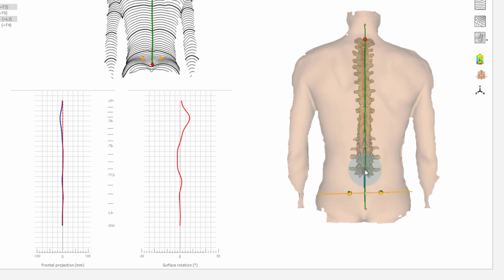What does it mean? First, it does not matter if the patient was standing rotated to the exposure plane due to a positioning error. The pelvic correction is able to calculate this out. In addition, the functional orientation of the spine to the pelvis can be recognized much better this way. Here it is irrelevant whether the spine rotates above the pelvis or the pelvis rotates below the spine. What is important is the arrangement of the spine in the symmetry or asymmetry. This can then become apparent with the pelvic-corrected view. A muscular imbalance can be more easily deduced.